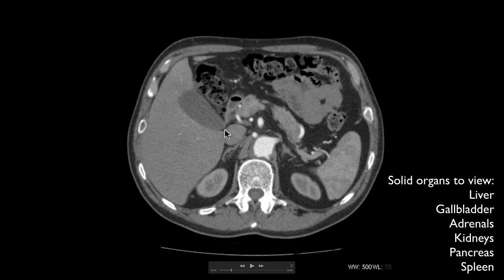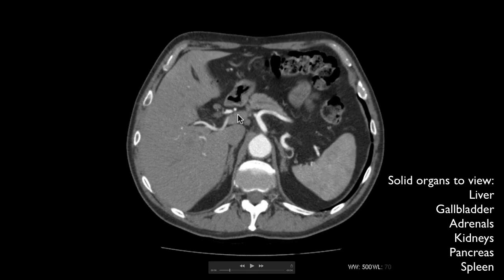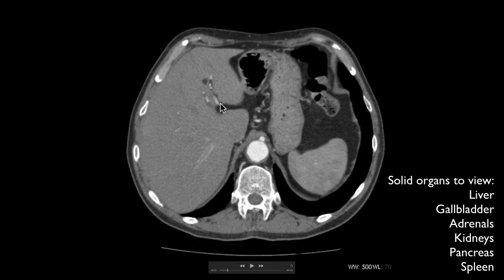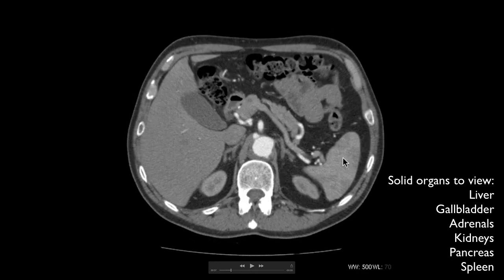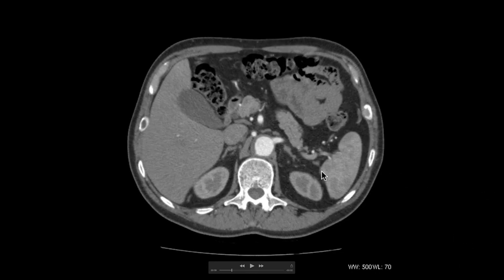Yeah, exactly. So for a standard CT abdomen, you would do it in what's called portal venous phase imaging. That's about 70 seconds after injecting the contrast, and this is the portal vein here. On portal venous phase imaging, that'll be full of contrast, and it also just makes liver lesions more conspicuous. On the arterial phase imaging of the spleen, you can see it looks a bit blobby and a bit heterogeneous, and that's a normal looking spleen on arterial phase imaging.